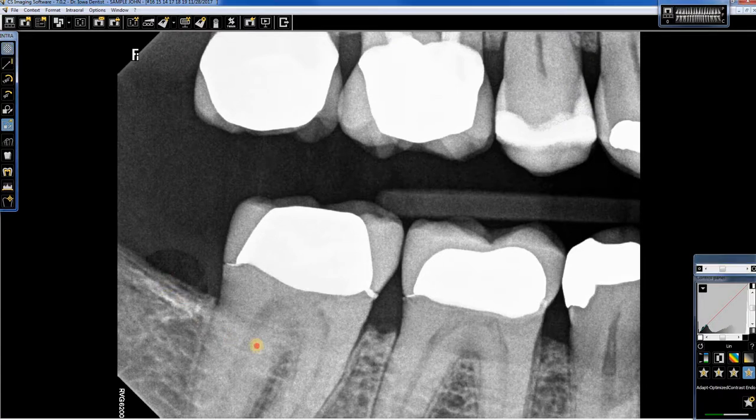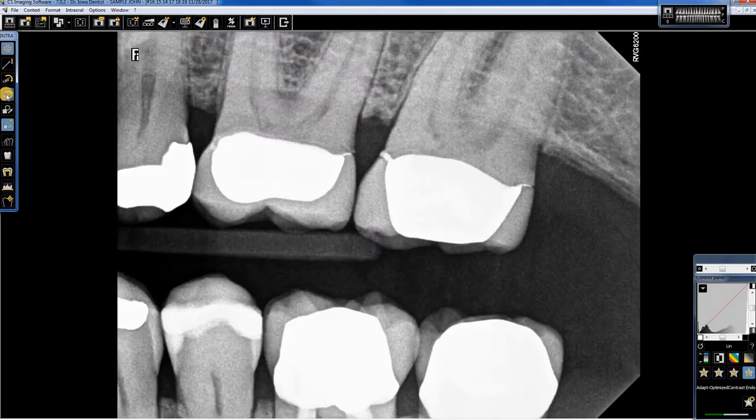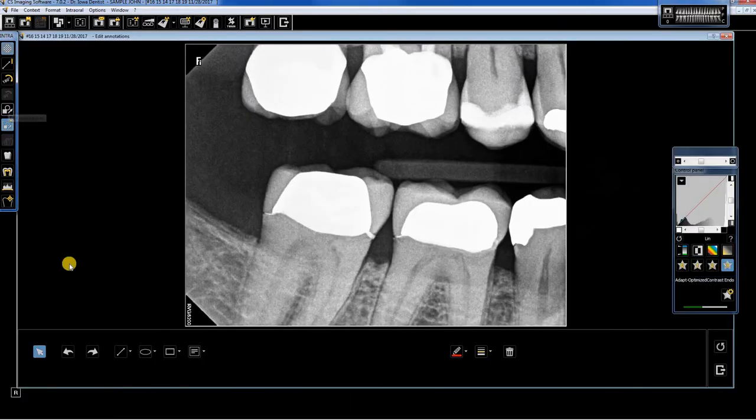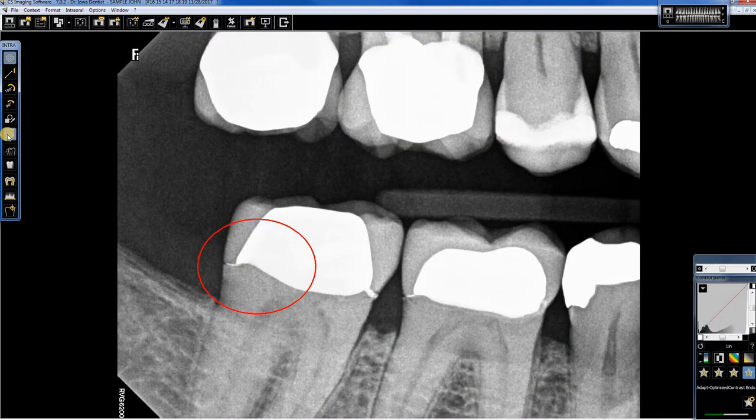We've got our highlight tool, of course. We can rotate these images easily as well. We can make annotations, add notes, draw circles, things like that. And then if we do something like that, we can hide those with this button here. Pseudo 3D I don't use a whole lot, but there are a number of other features available as well.